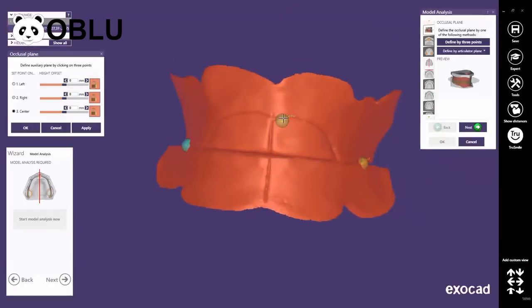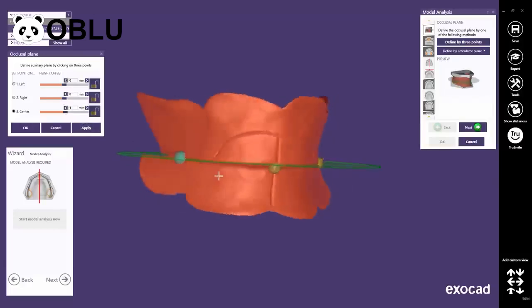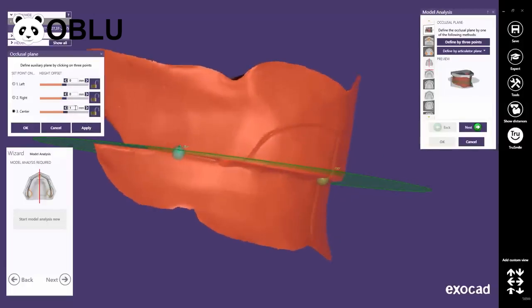If you have erroneously clicked an incorrect position, you can drag the point with the left mouse to the correct position. Click the Apply button to create the plane. The sliders can be used to change the height of the plane by defining a distance to each point. After each modification, you must click the Apply button to recompute the plane. When unlocking the distances, each distance can be set individually, which leads to an inclination of the plane. To undo all, set all values to 0.